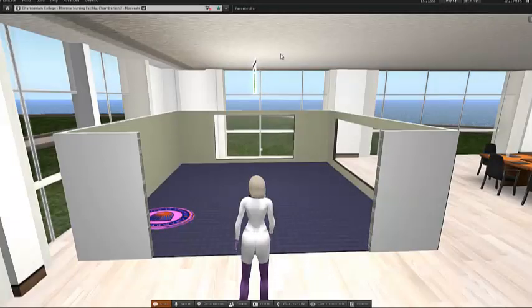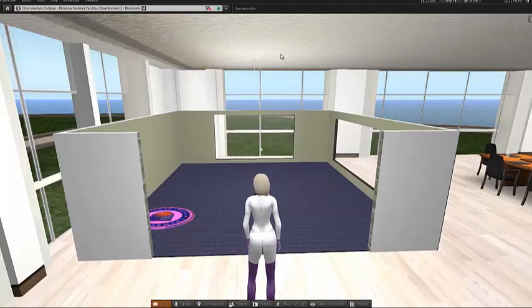Thank you for visiting the Innovation Lab. You're standing in front of the Electronic Blood Administration simulation. To experience the simulation and to learn from it, just start by clicking on the pink disc on the ground.